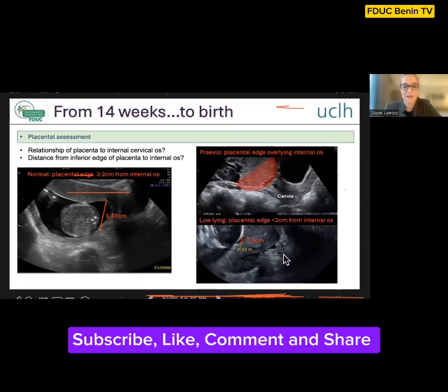And then finally, in the lower image on transvaginal ultrasound, you can see a low-lying placenta where the leading edge of the placenta is less than 2 centimeters from your internal cervical os. So you can just about see this sort of light grayish material. This is placenta. They've measured the edge to your internal cervical os, which is here, and that's just under 1 centimeter. Now, this image is extremely difficult to obtain on a transabdominal ultrasound.